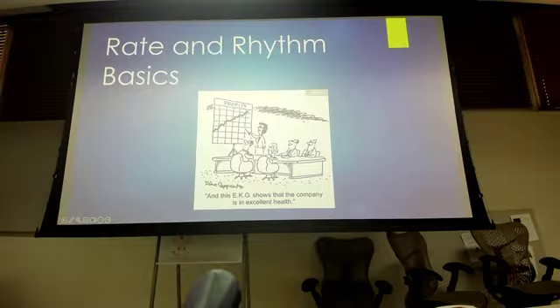And then we also talked about what does the P wave mean? What does the T wave mean? What about that QRS complex? And what is a normal QRS complex as far as horizontal time axis wise versus a wide QRS complex? Anything greater than 3 boxes is considered wide. We're looking for QRS complexes less than 3 boxes.